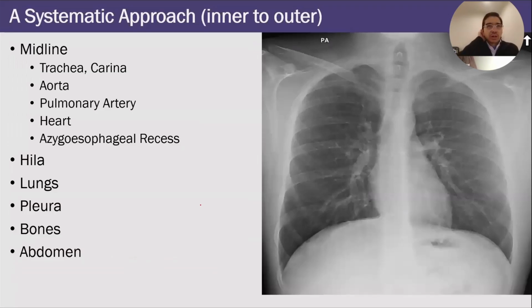Okay, let's talk about how I look at an X-ray, the order in which I look at an X-ray. It's not important that you follow the same order that I do, but I want you to develop some kind of approach and continue to use that approach every single time that you look at a study.